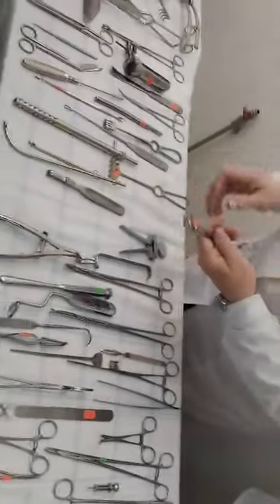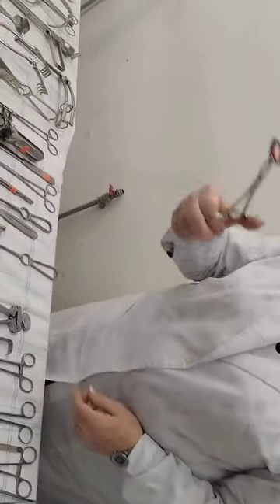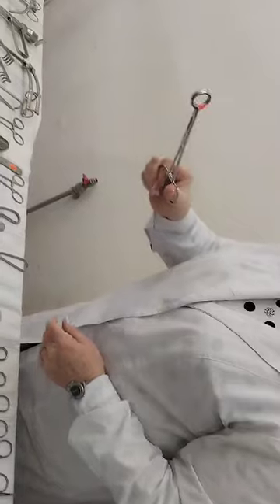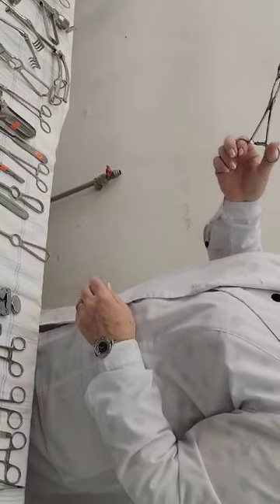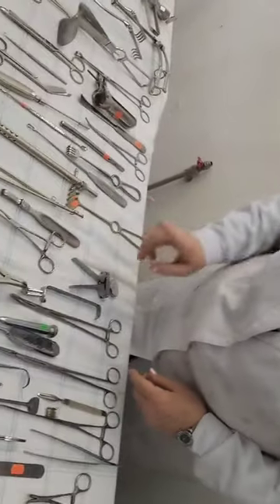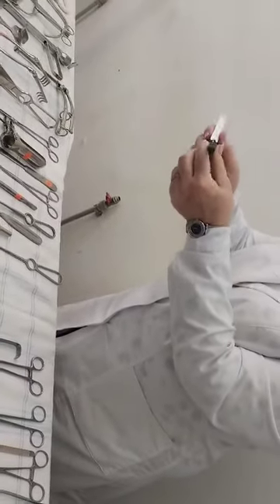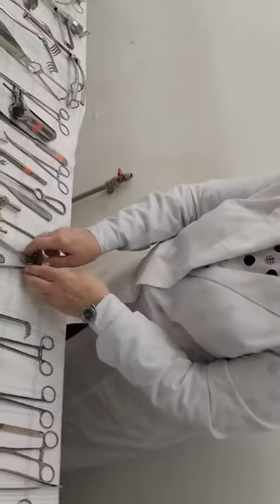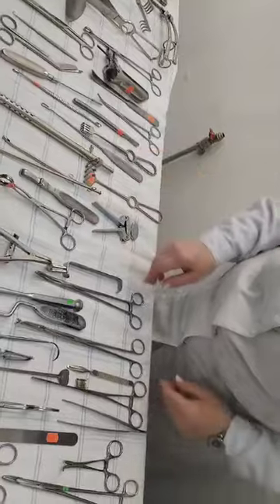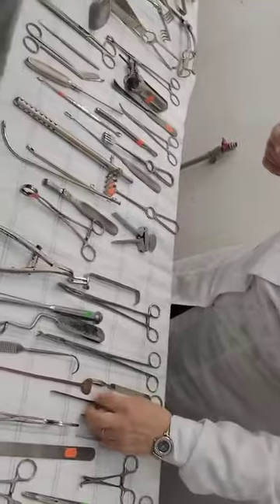and fixation on the tongue. These forceps are for the tongue, where students stop the story, don't listen to me on the exam. This is for the mouth. A retractor for the mouth in stomatology. For the mouth. Perhaps I will show it next. These forceps are very interesting.